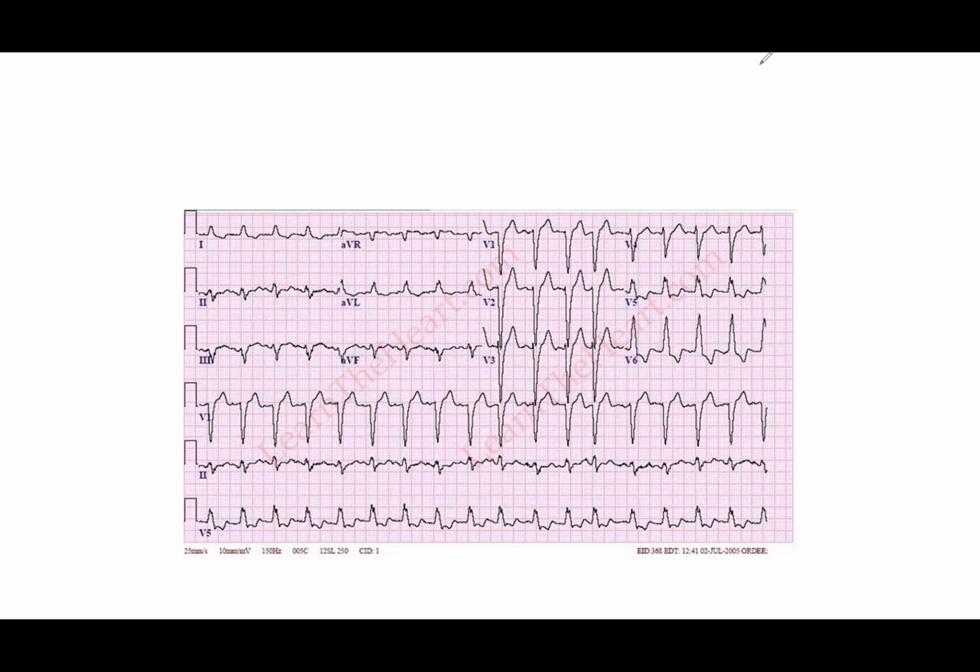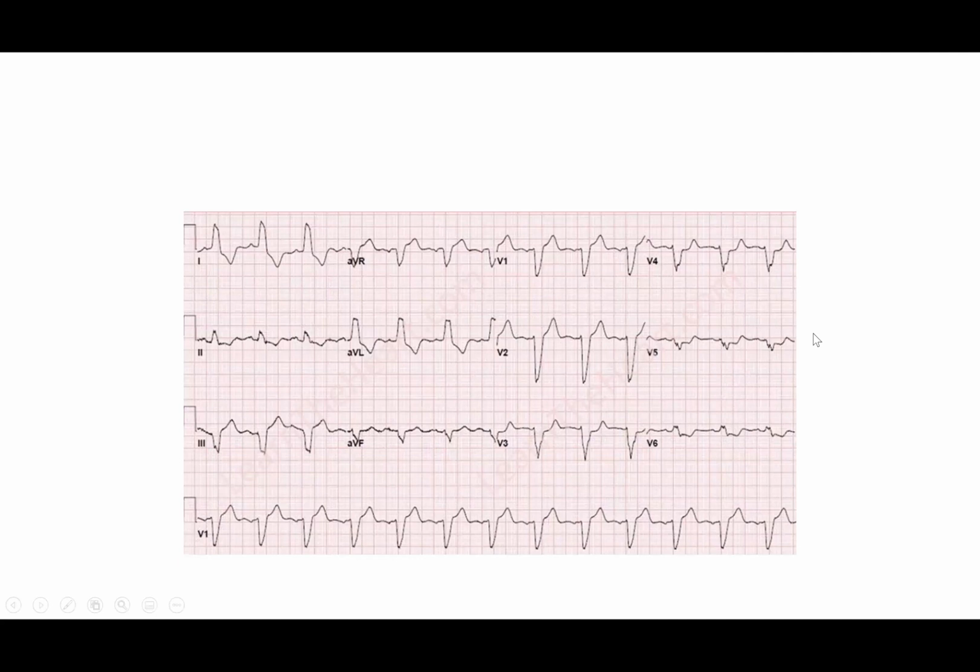What left bundles do we got? Let's do something different. JK, more left bundles. Okay. So, P waves, yes or no? Hard to see, but they're there, because that's a P wave, and that's a P wave, and that's a P wave.